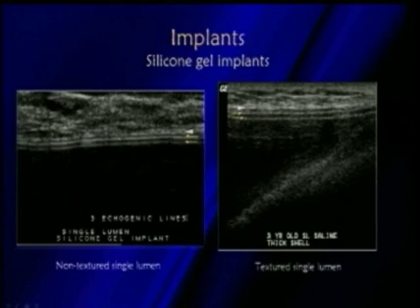We can see this is the outer wall of the shell. This is the inner wall of the shell, which looks like the reversed Oreo cookie. And then the body's reaction to that implant, it builds up this fibrous barrier between that. So this is the trilaminar, or the three echogenic lines that we're looking for to see if there is an intact implant.